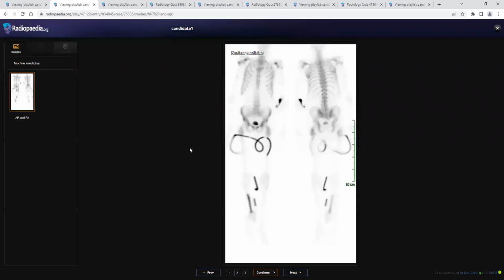Okay. I was provided with a bone scan of a patient who was admitted with trauma at home. It revealed non-visualization of the soft tissue of both kidneys with diffuse slight increased tracer uptake within the whole bone skeleton, and there is evidence of a Foley catheter inserted. This picture is suggestive of a prostatic problem with possibility.